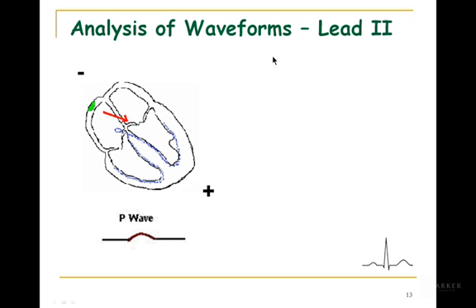You notice it's a little bit to the left, because remember, the left atria is going to take a little bit longer to depolarize because the electrical impulse originated in the right atria, but it has to travel over to the left atria. So the vector is always going to be pointed a little bit towards the part of the heart that takes the longest to depolarize. So we have this arrow pointing kind of down and a little bit to the left.